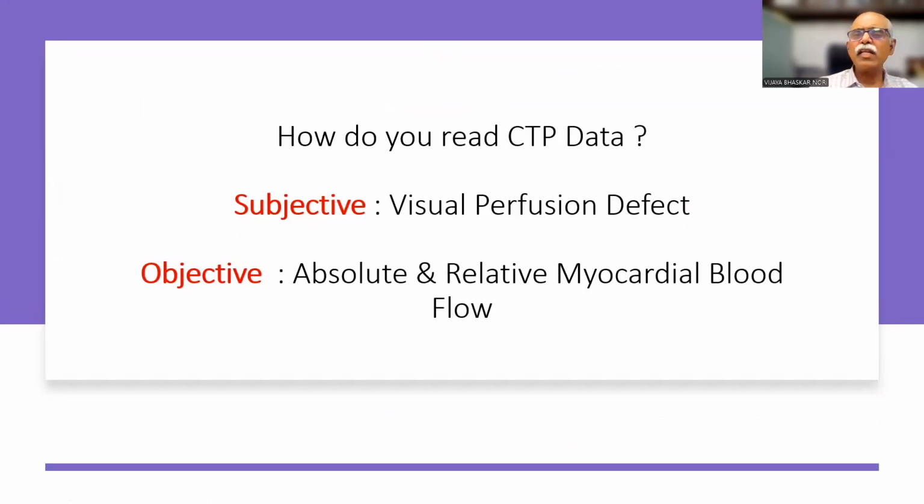How do you read a CT myocardial perfusion data? It is subjective and objective. Subjective is visual perfusion defect, and objective is by looking at the absolute and relative myocardial blood flow values.